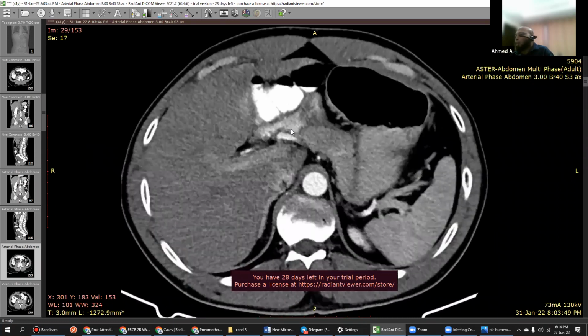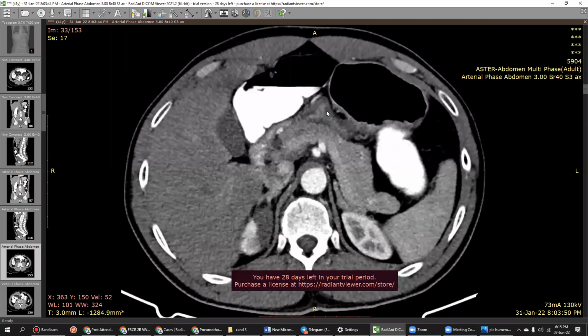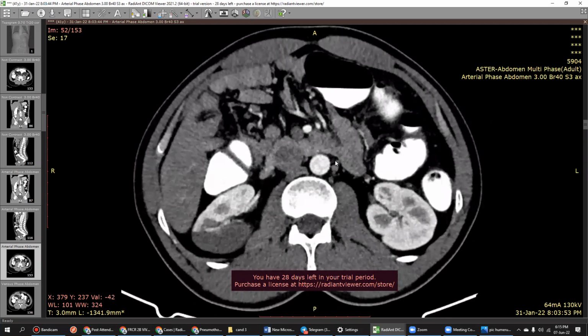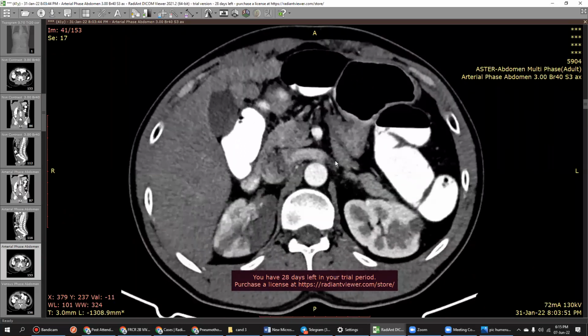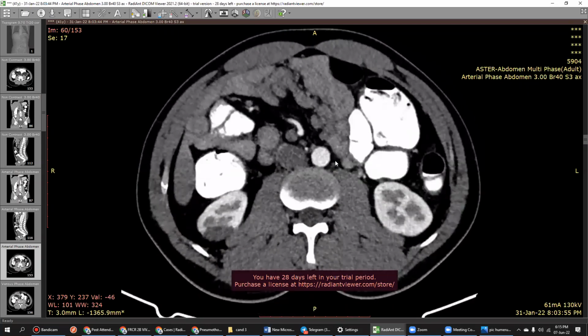Is it a renal infarct or pyelonephritis? How do you differentiate both? I think it is a renal infarct because it is a wedge-shaped area of almost non-enhancing kidney. I think there is evidence of a cortical rim noted, so I am suspecting infarct more than pyelonephritis.